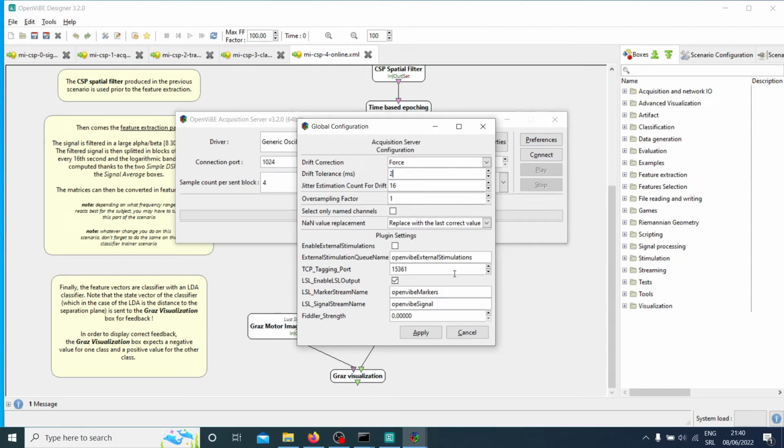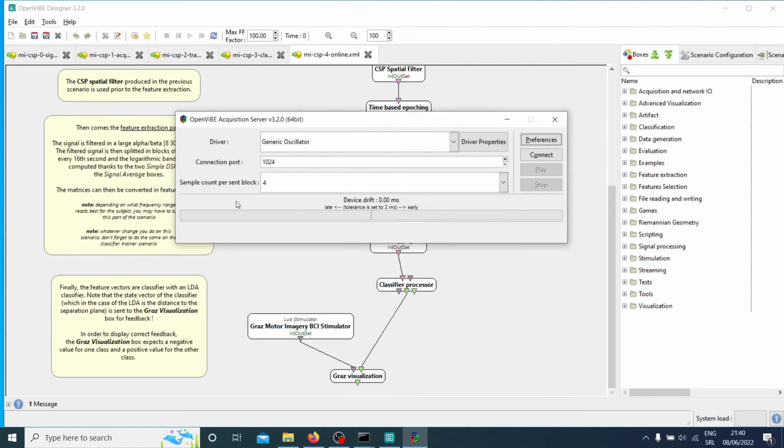If it's set to 2, for example, it would do this drift correction too often. If it corrects the data too often, you will create a lot of fake data. Okay, I won't let any late packets stack up, but if I refresh too often and replace the data with the ones that arrived before, I will just have too much false data.